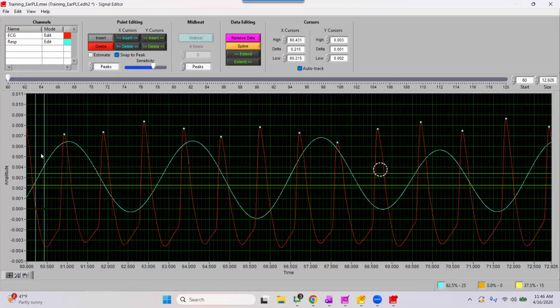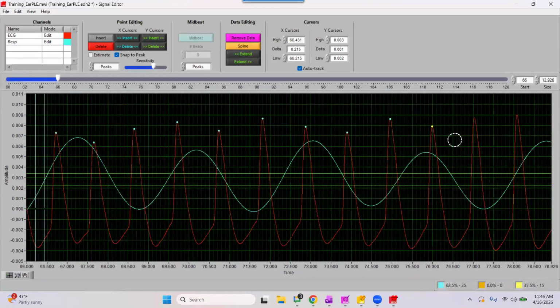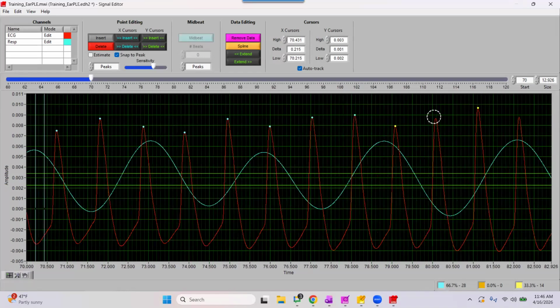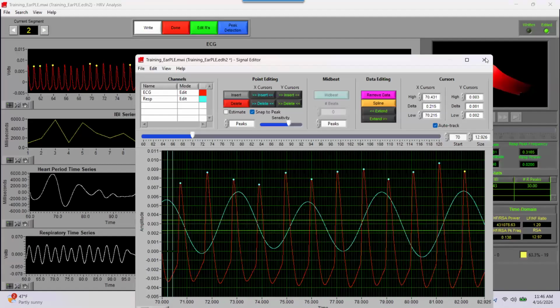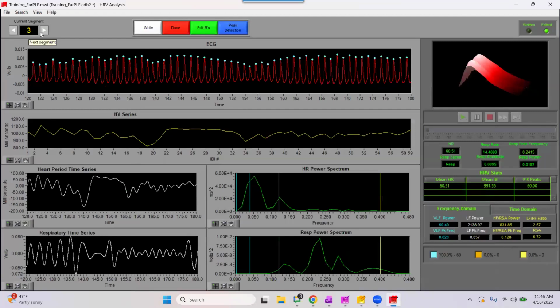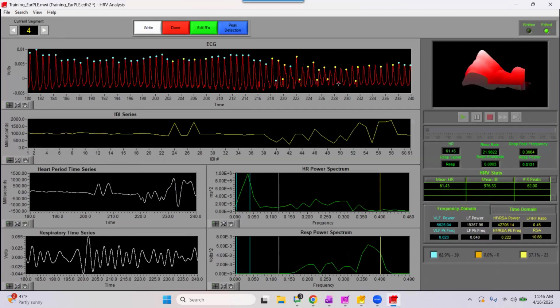But as you do so, you can start to see that we have blue dots stringing along the continuity of this data. So pretty straightforward, but I would just continue going on, giving a visual inspection to every single beat and making sure that these look good. So I'm going to close out of this. I could continue to keep inserting points for this segment, but I think you understand the flavor of the point inserts. So let's talk about some differences in some different sections of data.